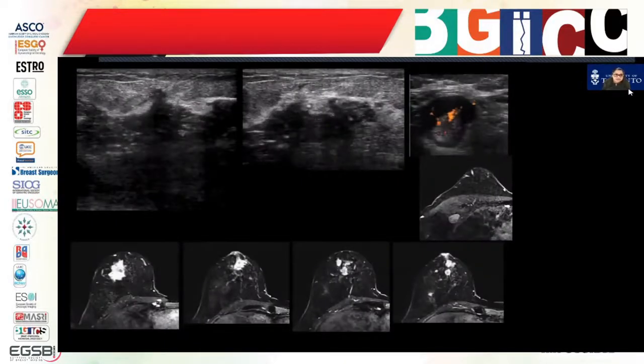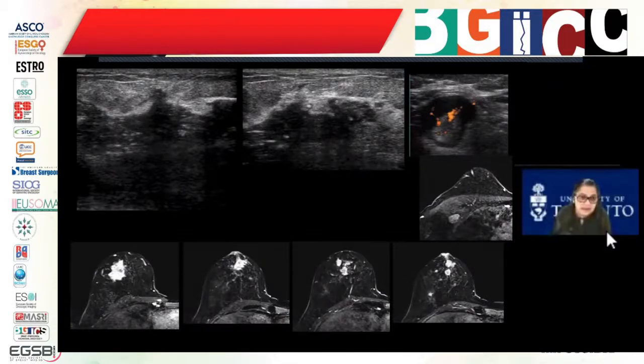Another example of extensive breast cancer involving the breast here, involving large volume, and this is the ultrasound image. You can see an abnormal axillary lymph node there, and you can see how in these multiple images of the breast MRI, we can document breast cancer much better. It is multifocal, multiple large areas. Involvement of the nipple is seen here, as well as a single large axillary lymph node in the level 1 position. So this is how we use MR.